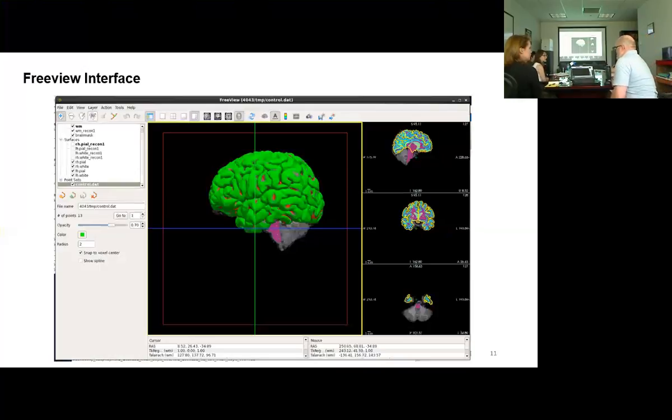But if you're going to do edits, if you want to get into that level of detail, this becomes pretty key, especially at the early stages here. But I use it all the time. We started doing this for Suen, and it's a lot of scans, and once we went from just trying to get a sense of what we need to do to ramping up to production level, where you're trying to get a lot done fast, this became not even just useful, but necessary to keep track of what's going on.